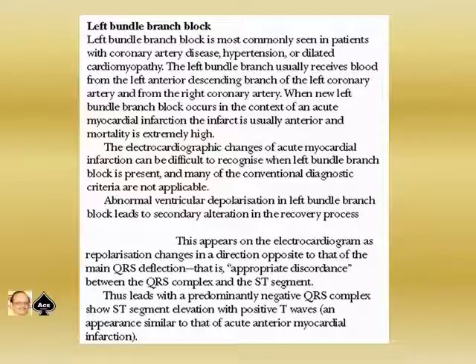This appears on the ECG as repolarization changes in a direction opposite to that of the main QRS deflection. There is appropriate discordance between the QRS complex and ST segment. Thus, leads with a predominantly negative QRS complex show ST segment elevation with a positive T wave, an appearance similar to that of acute anterior myocardial infarction.